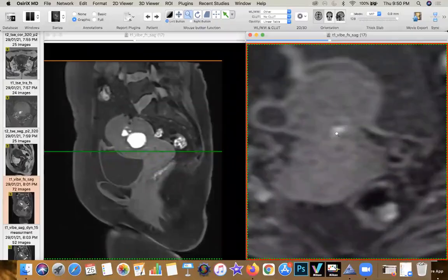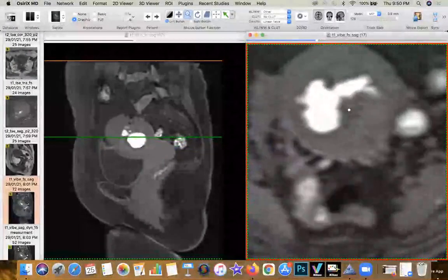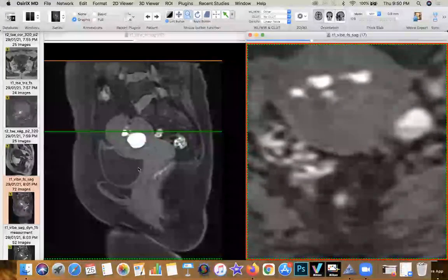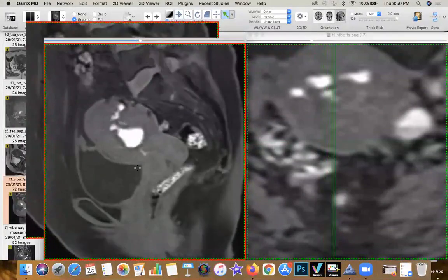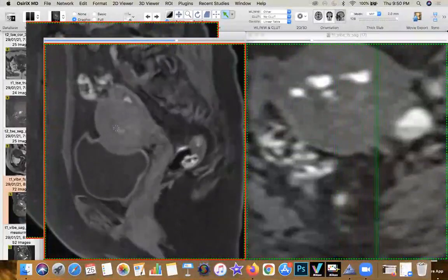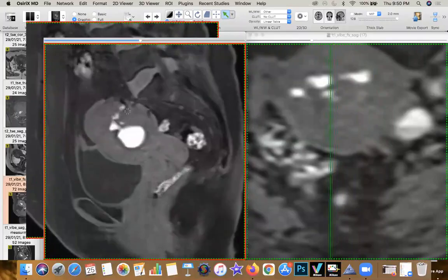So this is the cavity, which is kind of compressed, and you see this bilobed hemorrhagic lesion. And if you note very carefully, all these kind of structures which are seen here, this is the site of surgery. You can appreciate the surgical site here. You can now appreciate how this hemorrhagic tissue has started to kind of radiate from the cavity or the center of the corpus and have gone outwardly and are now seen to reach the uterine serosal surface. So what else do you see?